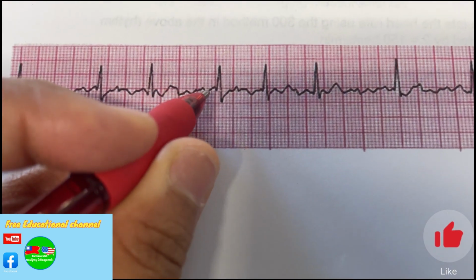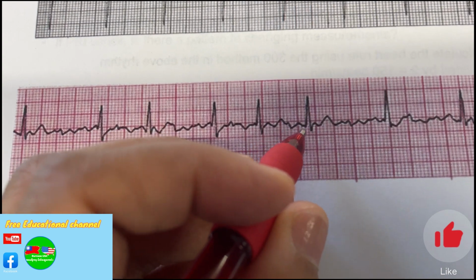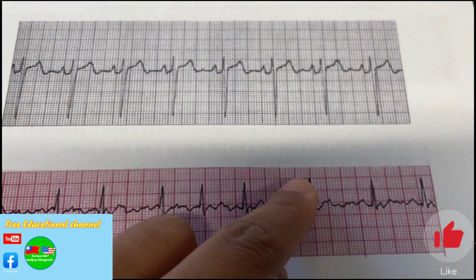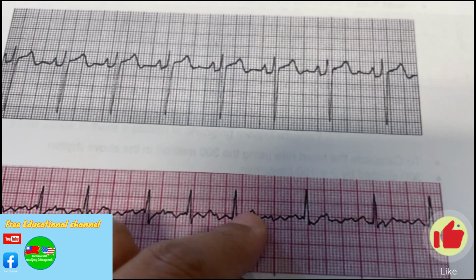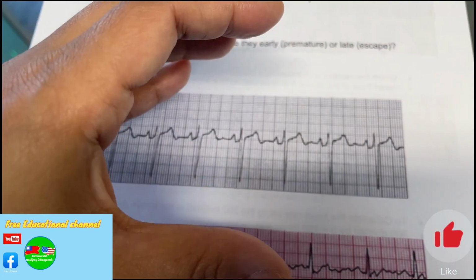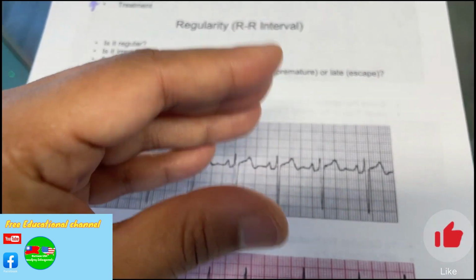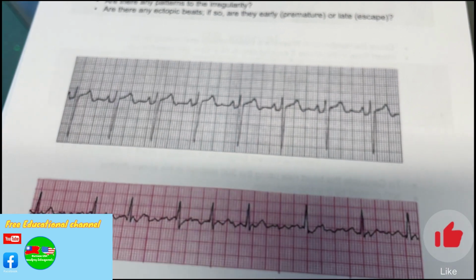You have P, QRS, and kind of T, P, QRS, kind of T, but you have so many extra waves. So this is more like fibrillation. You see this QRS is a ventricular activity, but you have a problem with the atrium. Your atrium is not squeezing in one clean shot, it's squeezing like this. That's fibrillation. Fibrillation has to do with the atrium problem because you have a QRS, you have a ventricle, so that's atrial fibrillation.